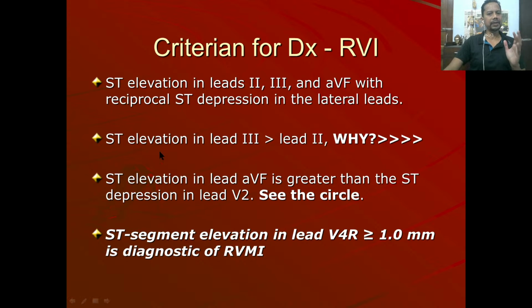Then there is ST elevation in lead 3, which is more than in lead 2. Why? I will show you in that circle. And again for the same reason, because lead 3 is over the right ventricle, it is sort of looking towards the right ventricle in this case.